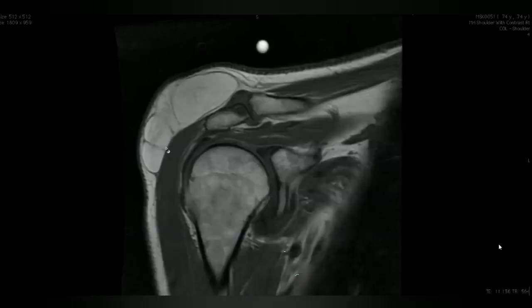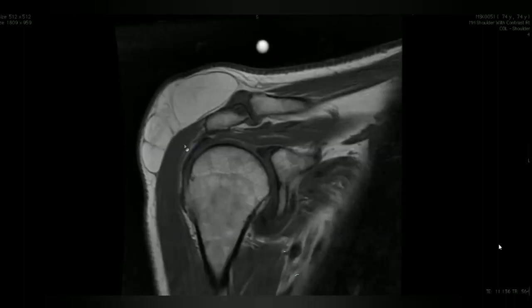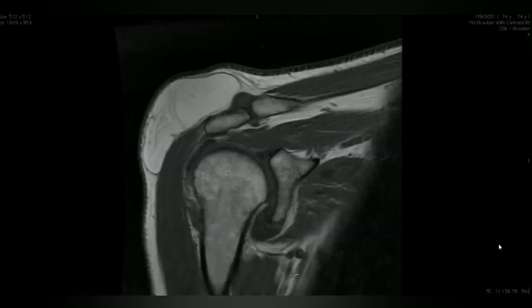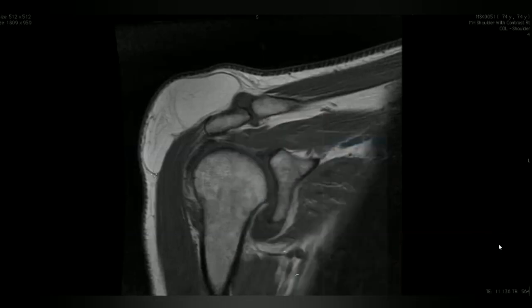Okay. So you're talking about these. Yes, sir. So these are called septations. Yes, sir. And we'll come to that septation as well. So it is T1 hyperintense. So what is it? Sir, first will be lipoma, sir. Okay. Any other differentials? Lipoma or hematoma. I will ask the history.